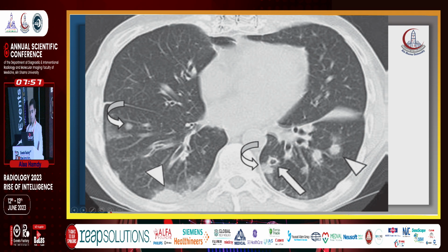We have here a 26-year-old man, 1 month after transplantation. We have multiple nodules, ground glass, and cavitation. Aspergillosis was confirmed.